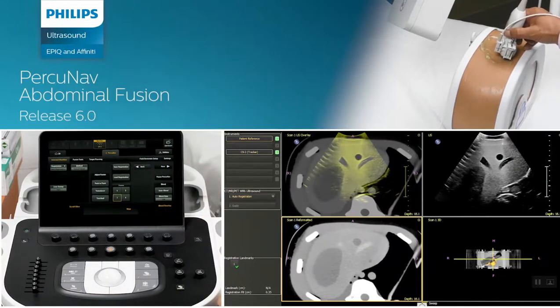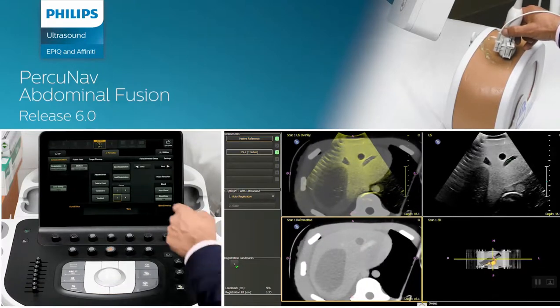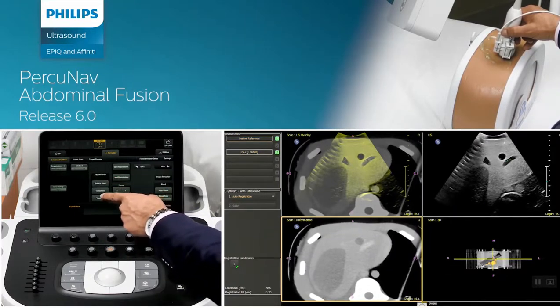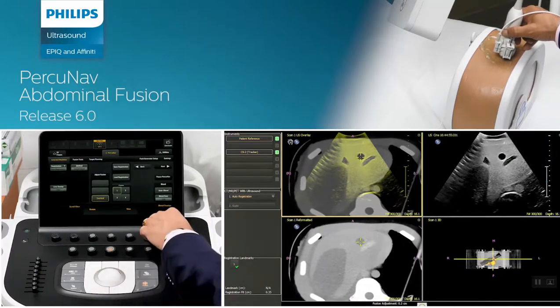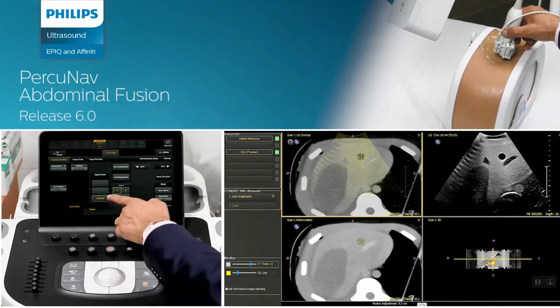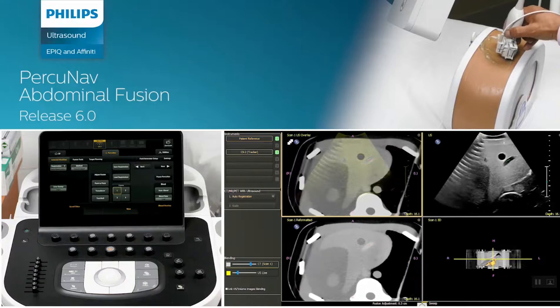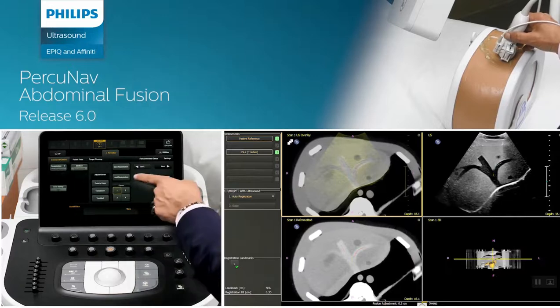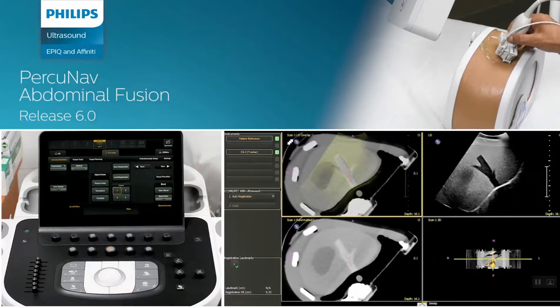In case you want to make fine adjustments to the fusion, you can use the following controls, that is point-to-point, transducer, or trackball. After making these adjustments, if you are not satisfied with the accuracy of fusion, then you can reload the saved registration. This will reset all the fusion adjustments that you have done.